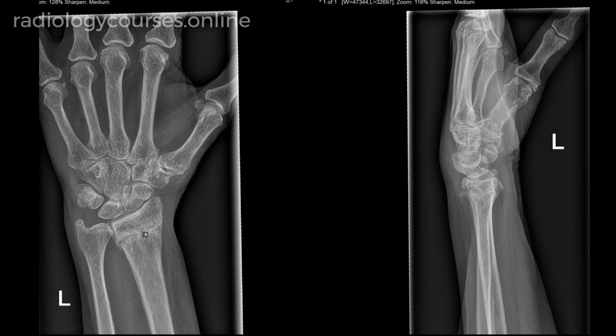This fracture line appears to be fused on the radial half and still appears to be open, or seen, on the ulnar half. Hence, the features are suggestive of partial union. However, I would recommend a CT scan of the wrist for further evaluation to assess if there is a non-union or delayed union. I would ask the primary care referring physician to refer to the orthopedic team for further clinical evaluation.